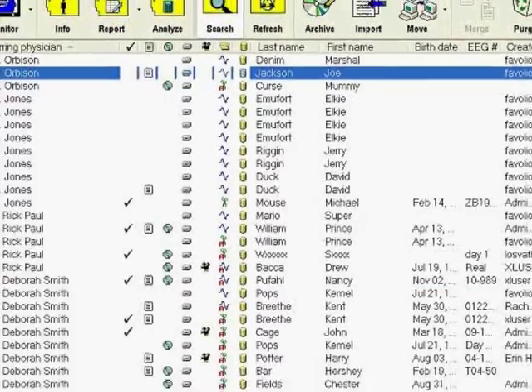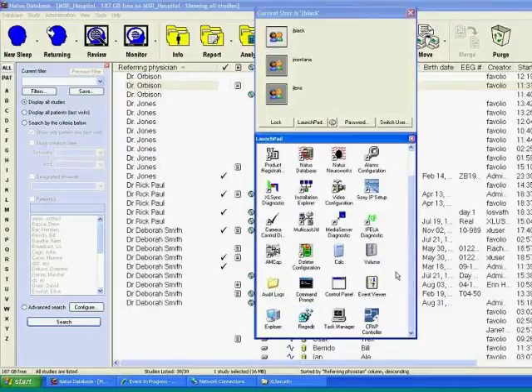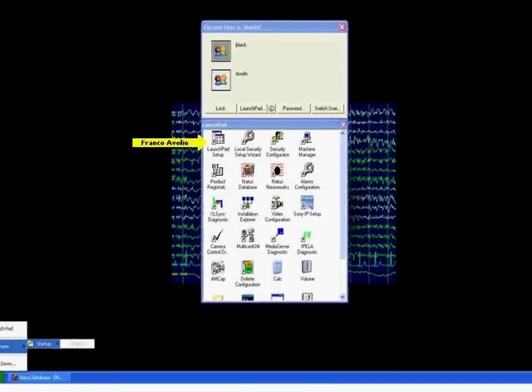Click Close. So that now, if I'm logging on as a technician, right now I have the administrative role, so as Joe Black, I'll see that software is located down here. If I were to switch user and log on as a technologist, you'll see that the CPAP controller is accessible. If I double click on it, it opens up my device. So you want to use the Launchpad setup if you want to control specifically what applications you want users to have access to. And again, it's a cleaner look, and you can really control what users have access to.